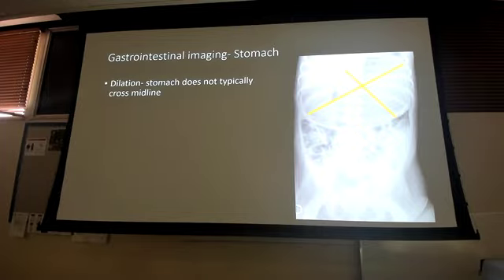Dilation. The nice part about dilation of the stomach is it's usually due to air. Okay? How old is this patient? Just give me a general age group. Pediatrics. Why do we think this is more common in pediatrics than adults? Anybody think why? They're swallowing all this air. Feeding, right? Especially bottle feeding, nipple feeding, doesn't really matter. If they don't get a good latch on either the nipple or the bottle, whatever they're eating, they're swallowing a lot of air.